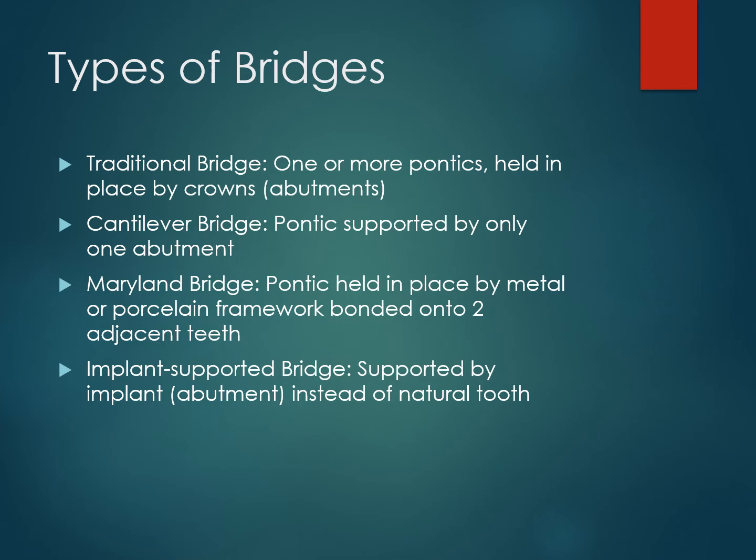It looks like two teeth, the abutments, and then the bridge is the pontic where you walk across the middle, right? A cantilever bridge has a pontic, but it's only supported by one abutment. So it's one fake tooth, and it's only attached on one side.